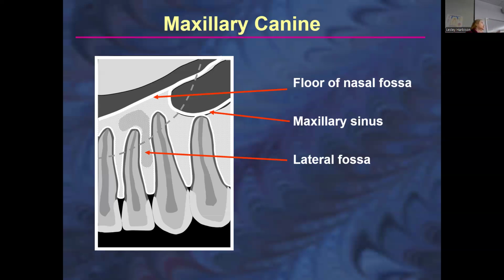So, was that a question or no? It's canine fossa. Could be. Yeah, canine fossa, lateral fossa, either way, it's right.